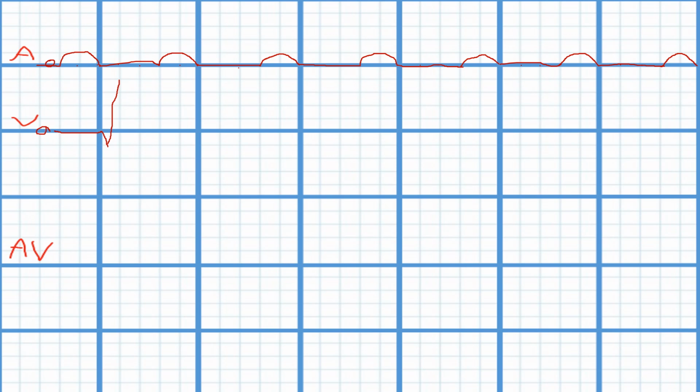So negative 0.1, positive 0.4. Once again, negative 0.1, going down to 0. And then we'll go 1 little block over. And we're doing our T wave. Our T wave is going to be up to 2, down to 0, and it's going to take 2 little blocks, so 0.08 seconds. And so now we're having to repeat every 8 little boxes.